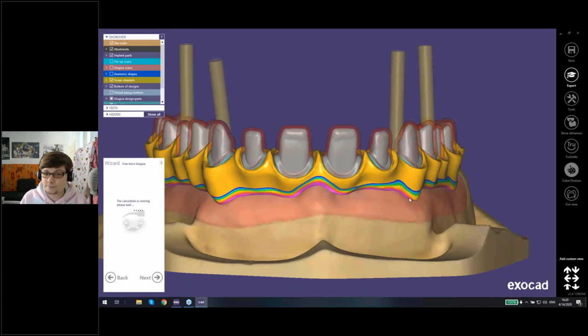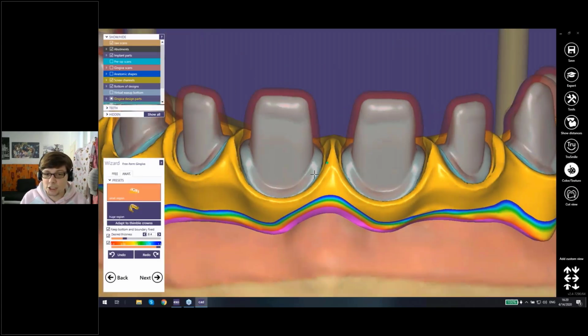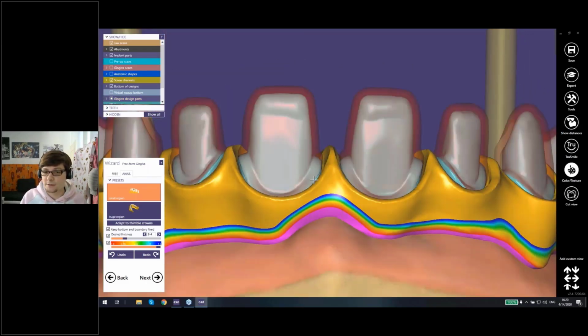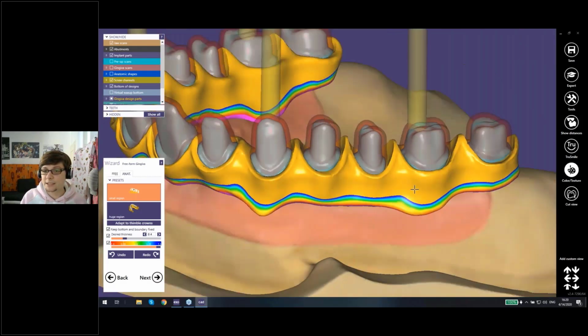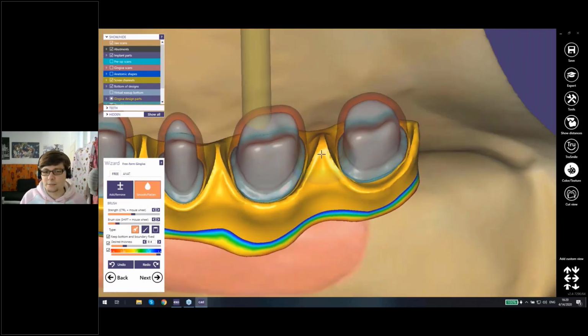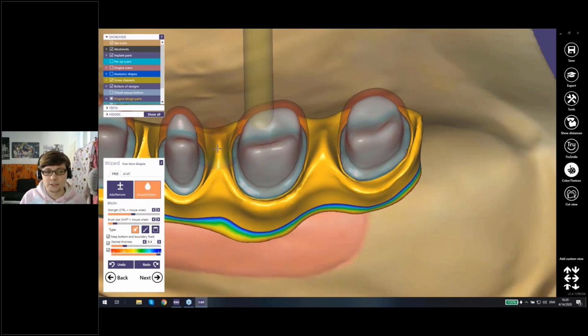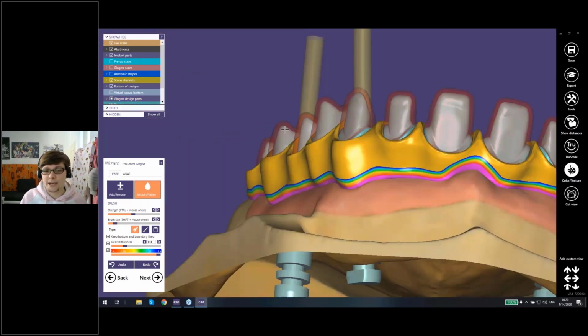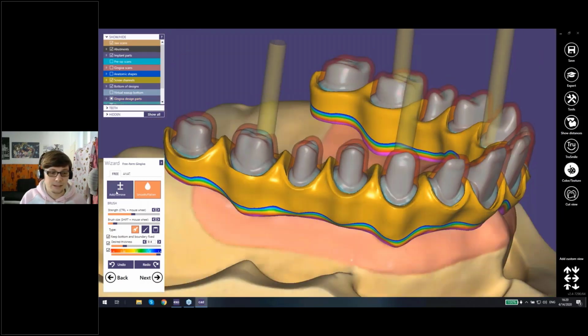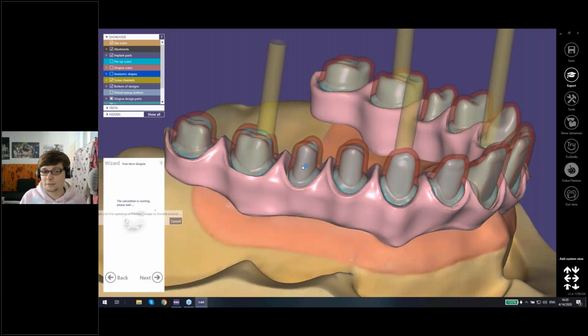And you will see now that the software just cuts away the gingiva around the crowns. So my crowns that are placed on top will fit on those thimbles in the end. They can be placed. I can still freeform my gingiva mask now. If I have areas like this and I say, oh, this is a little bit too harsh of a cutoff or too thin of a corner here, I guess this might break later on. So I can just freeform it a little bit and smoothen it. And as always, I can just press adapt again, because now that I freeformed it, it might be that the intersections are back. So the software always has the option to redo all of those adaptations, like the adaptation to antagonists as well.